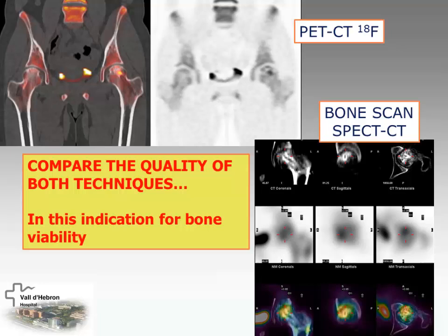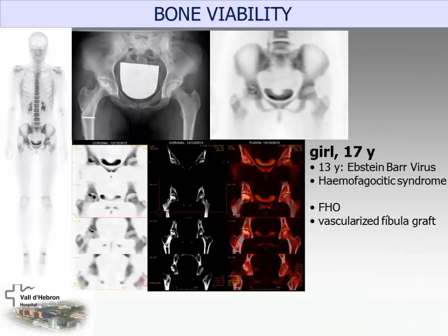Which side do you think has a better prognostic? The left side, with the injection of stem cells. Okay, this is a clinical trial. Is a new technique, and it seems that the forage plus stem cells will have a better value for the treatment of these patients. And compare the quality of the image of the PET with fluorine compared to the bone scan. It's really different, not?